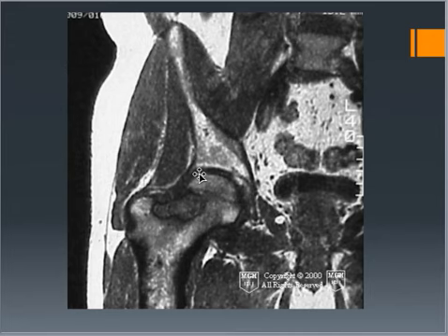This patient has a mass in the surgical neck of the femur. So here's the head of the femur, and this area here is what we call the neck of the femur, the surgical neck. So you can see this mass, this dark area right here in the femur.